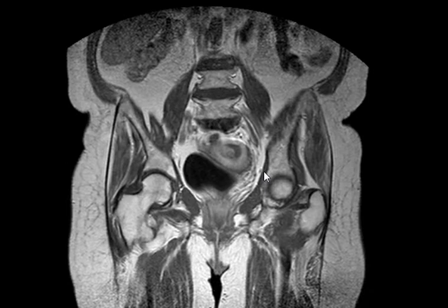Hormone replacement therapy goes like this picture, with an enlarged uterus and increased thickness. Hormone replacement therapy will give you a normal appearing uterus in a postmenopausal female, like someone who's 55, 56, up to 60 maybe. The uterus looks normal, the ovaries look normal, there are some follicles here and there, endometrium is good, but the patient is menopausal.